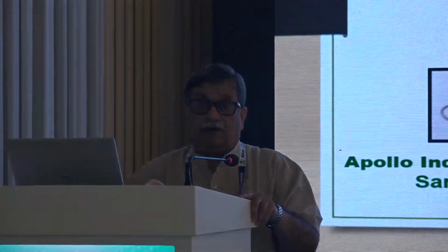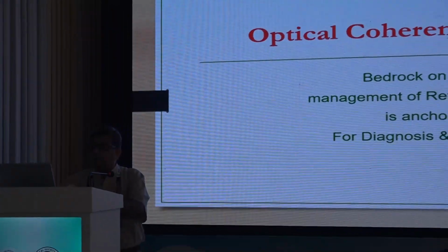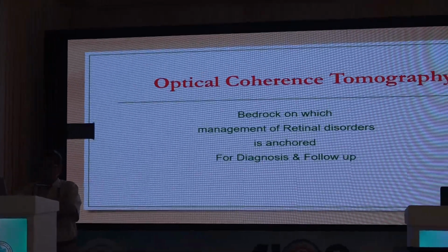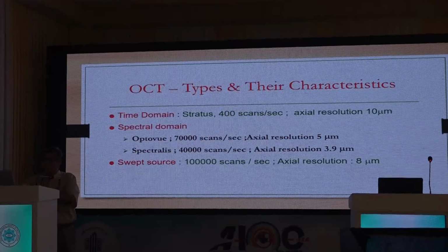So without any further ado, let's go back. We've gone through how you use the OCT for anterior segment and glaucoma. Now what about the retina? Well, the fact is that the OCT is the bedrock on which management of many retinal disorders is now anchored. And not only anchored the diagnosis, but also their management and follow-up.